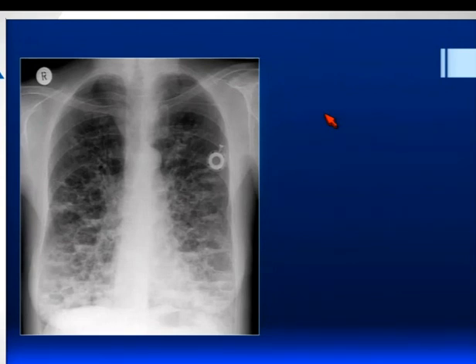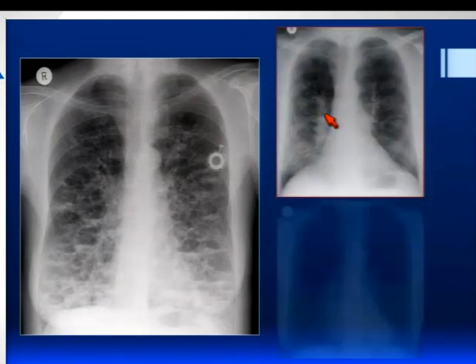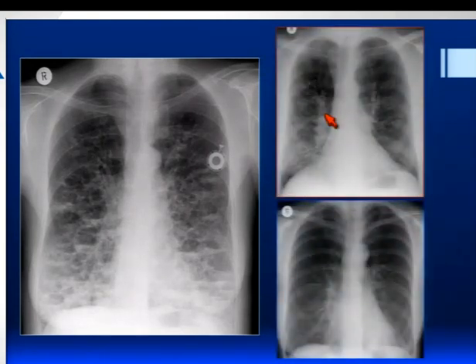But this is not the typical patient with bronchiectasis that we see in 2013. This is generally what we see. Now, you'd be hard pushed to make a confident diagnosis of bronchiectasis on either of those chest X-rays. The point being that in most patients, bronchiectasis tends to be relatively mild.